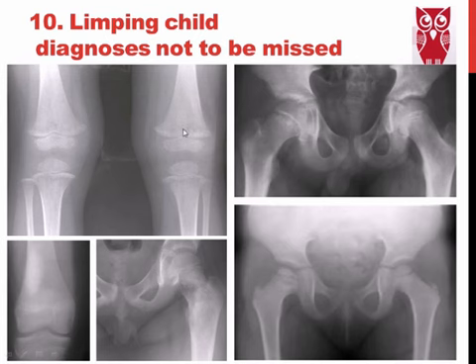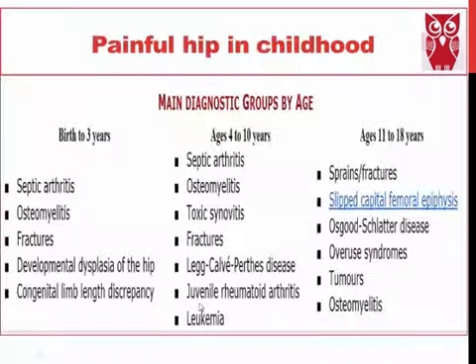So here you have the classic site predilection for osteomyelitis against the growth plate, but this is bilateral in all bones, so this is leukemia, the classic appearance. And this hole in the bone is not against the growth plate or an apophysis, it's somewhere in the middle, so this is LCH. Remember that, like in the abdomen, in the painful hip, the main diagnoses are age dependent.